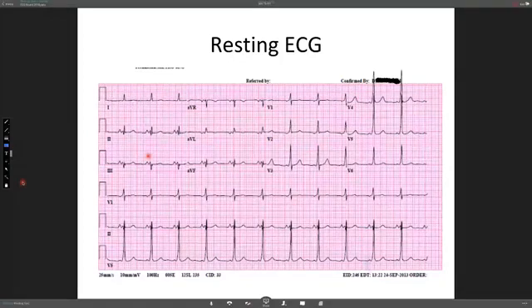Sometimes if your finding doesn't fit all the ECG leads where you expect the location of the accessory pathway, then you should think about two possibilities. One is whether you have a fusion of conduction between the accessory pathway and normal AV node conduction, or whether you have two accessory pathways. Without complicating this, I know this is kind of advanced level, but for a simple approach for localizing an accessory pathway, the first starting point is whether this is left-sided or right-sided.